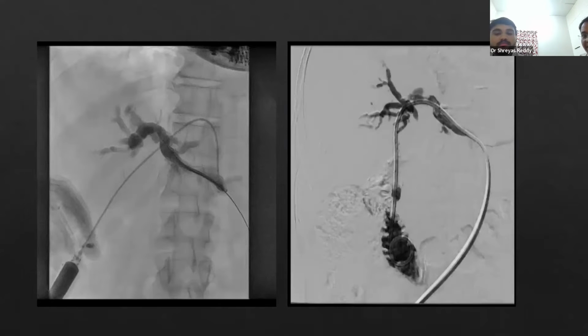So this is an internal external drainage. What will be the next step in this case? We will be performing a stenting, which is a total internal drainage. Why would you perform a stenting in this case, and why not leave the pigtail catheter there draining? The patient can lose electrolytes and important bile salts if we leave it externalized. Therefore, we want to restore the normal physiology as soon as possible, so we will choose stenting.